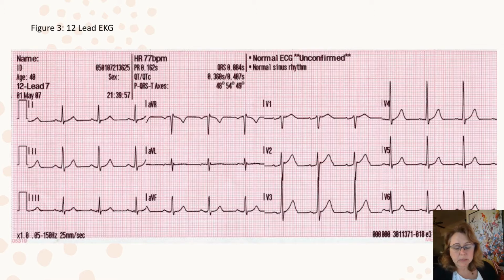And that makes sense. If we think about this, lead 1 looks from the right shoulder to the left shoulder, and that electrode is posted on that left shoulder or left arm, somewhere in there, and it's seeing that energy come towards it. It is a positive deflection.